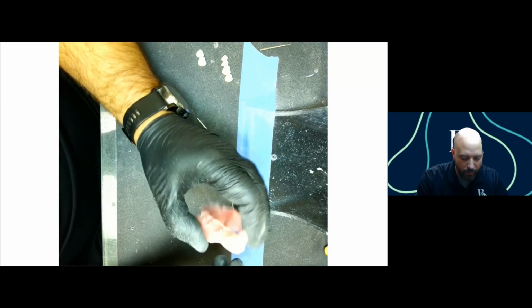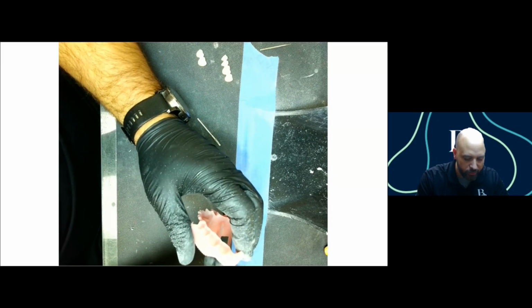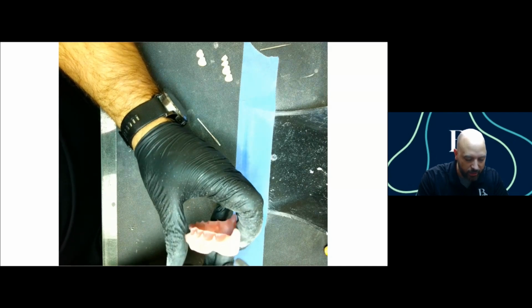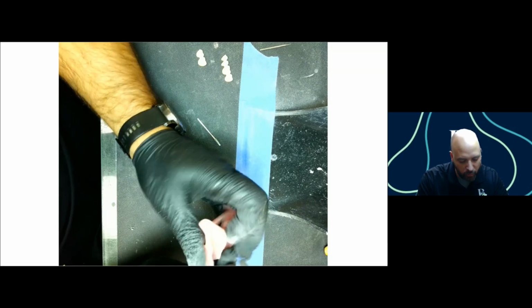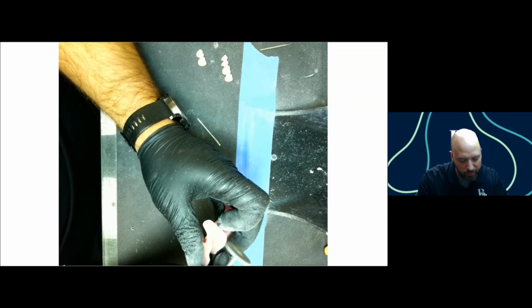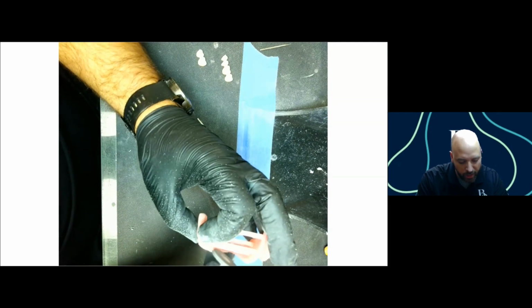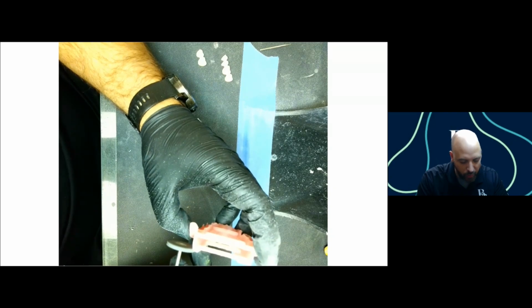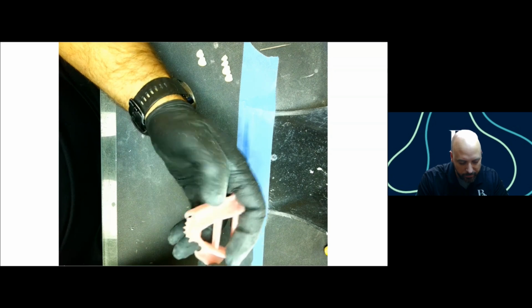And if you're worried about over finishing your borders, you can always slightly overextend them in the design. And then when you're here, you can finish them back to where you want them once you get these support nubs finished off. A lot of newer users will do that just to be sure that they're not over finishing their connectors here.